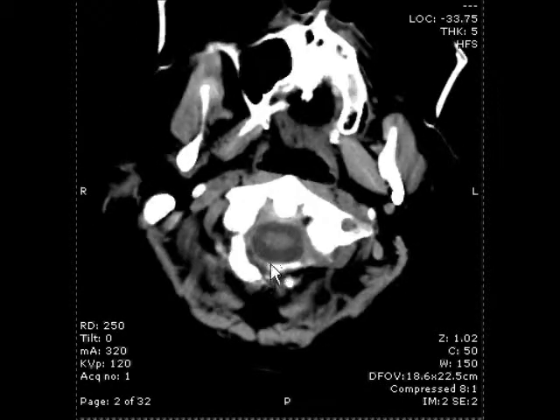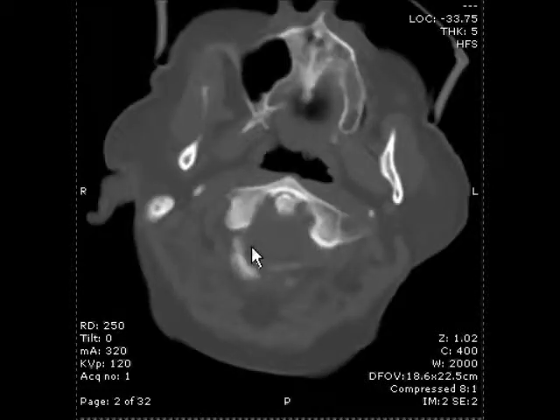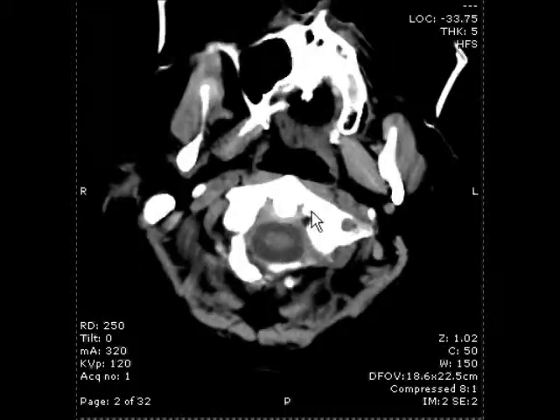And then it's important to look for any low-lying cerebellar tonsils, and I usually recognize that if you're at the level of the dens and you still see cerebellar tonsils, which we don't see here, then that would be abnormal, indicating that they're low-lying either due to a Chiari malformation or herniation from mass effect. So that's important to look for.